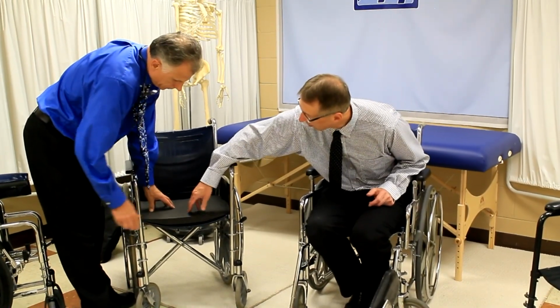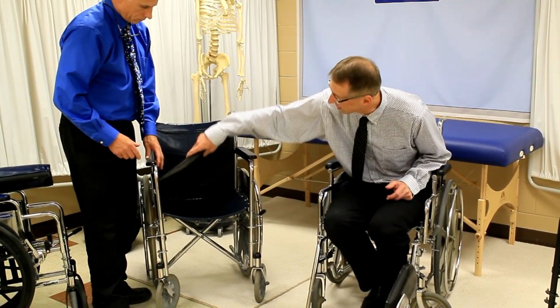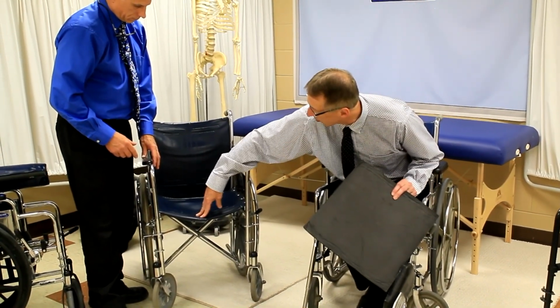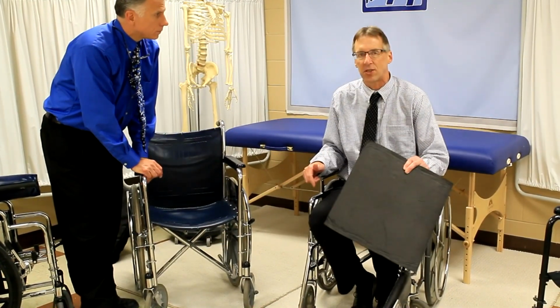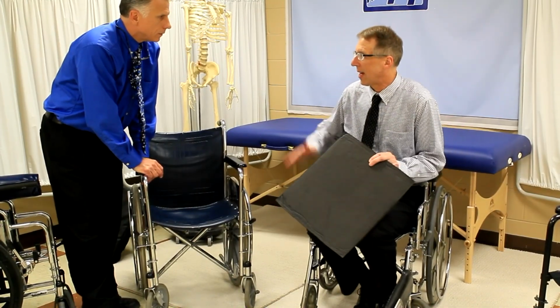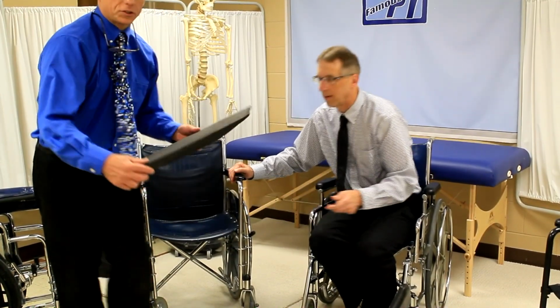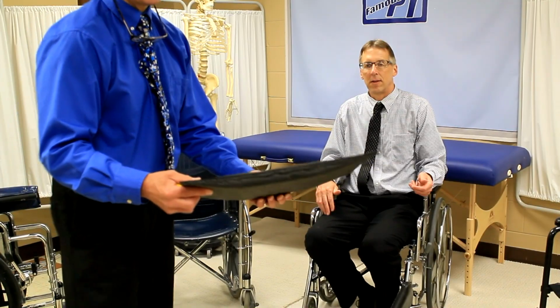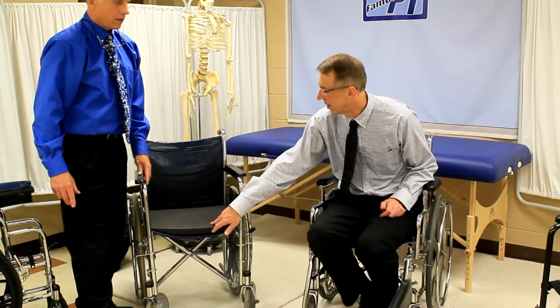So with a lot of people, we're going to put this in. This is a little corrective device, because as you notice, a lot of chairs have this sling here. And this sling starts to wear out after a while and really starts to sling. And what happens is people don't sit straight then, they start to get curved. So the pelvis can't sit level. This flattens it out. Can you see it's thicker here and it tapers here and here? It takes the sling out of it. These are nice, I like these. And they're not expensive either.